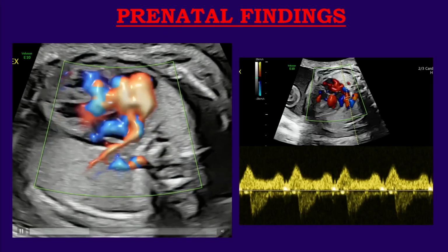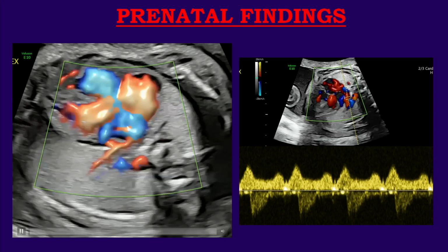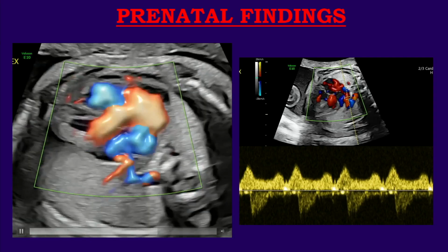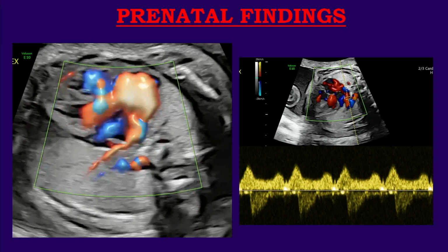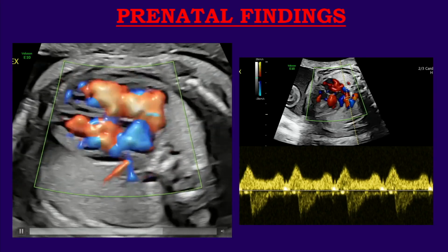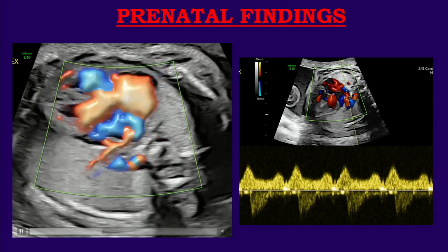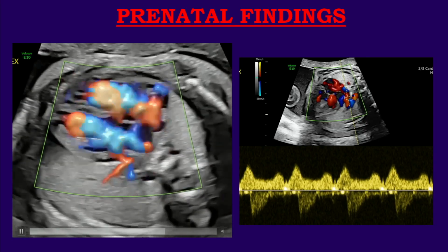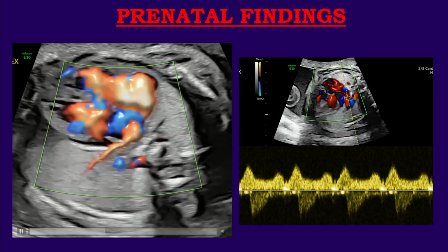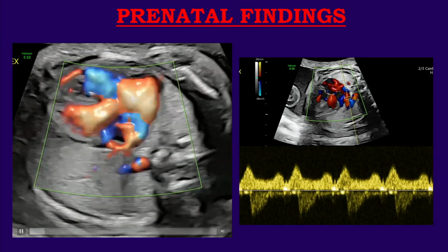Well, let's open up, even though we want to keep it narrow, so you still cannot see any venous return from this smaller portion of the lung on the right, but from the left we have a perfectly normal blood flow in these pulmonary veins. So here you need to stop for a second and think what type of pathology you are dealing with. And this is the classic presentation of the hypoplasia of the right lung, and this corresponds to the Scimitar syndrome.